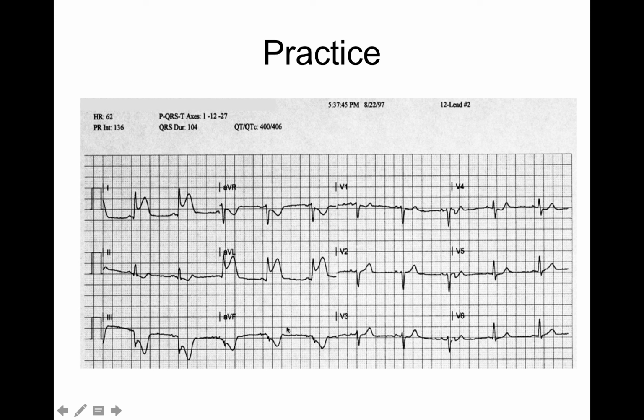Okay, V1, V2, septal. I really do not see that big of ST changes here. Anterior, no ST changes here. Lateral, no ST changes here. Now I go and look at my very final thing, my 2 lateral leads, my other ones. Now we have a big problem. This is what we call a fireman's hat, and this is not a good indication. So these two correspond with each other.